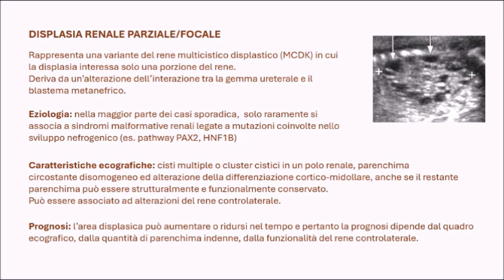Ultrasound examination in this case usually reveals multiple cysts or clusters of cysts located at one pole of the kidney. The surrounding parenchyma, which is rarely completely unaffected, in the vast majority of cases shows a heterogeneous appearance and an altered interface between the cortical and medullary regions.